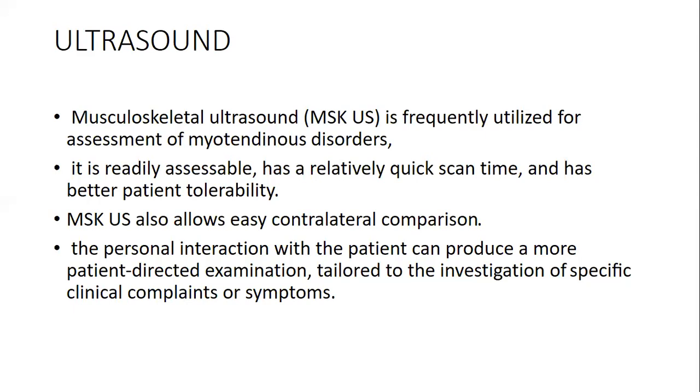Ultrasound of tendons. I was thinking that Cuthbert has dealt a lot with the MSK here, and we are so grateful for that. So like any other tendon that he has discussed, MSK ultrasound applies as well to the Achilles tendon. MSK ultrasound is frequently used for assessment of tendonitis.